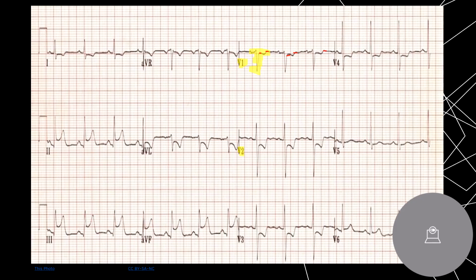Right, a little ST segment depression. Again, this is baseline. Right, QRS turn. So this whole thing is the T right here, which means this is your J point right here. J point, baseline. J point, baseline. So definitely depressed in here as well, here as well, here as well.